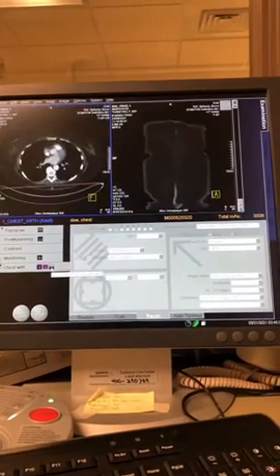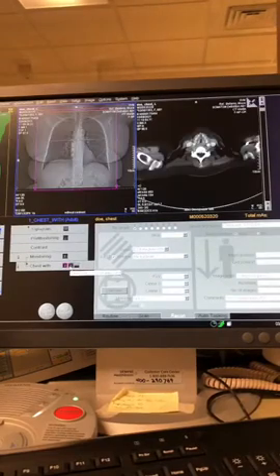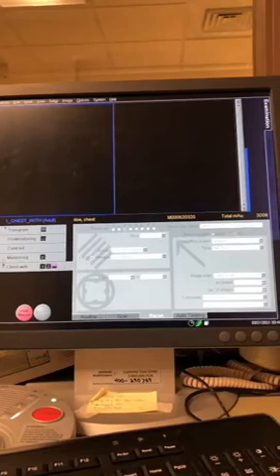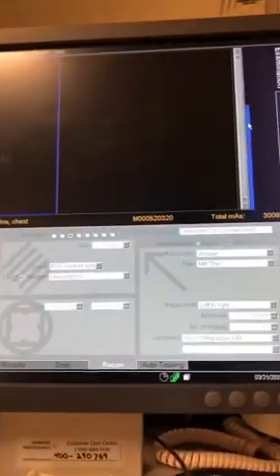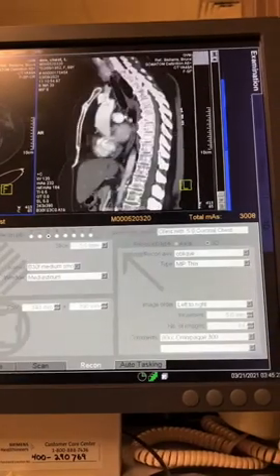It'll take a little bit. You can see it's thinking down here if you look at this little box, but we'll let that spit out, and then we will jump on over to our next study, which is going to be, we'll go ahead and do a pulmonary embolism. There's our sagittal. You can see it popping up that quick. It's gorgeous.